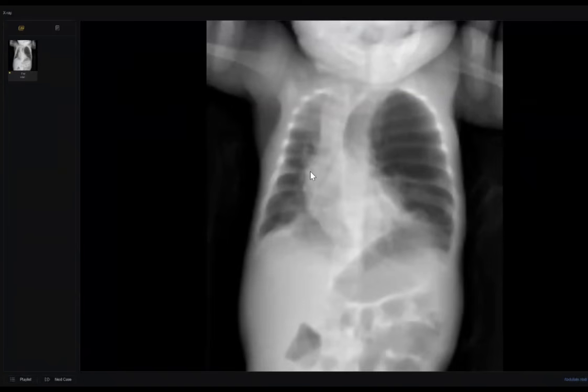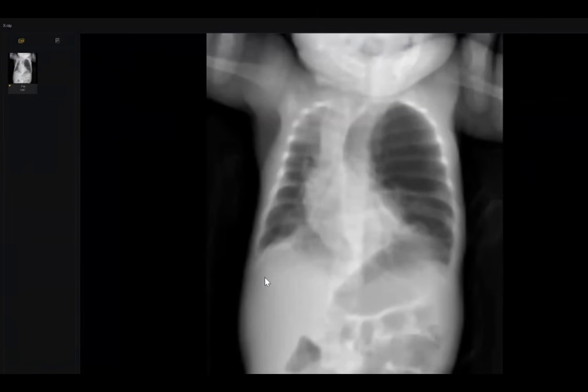Sir, I'm provided with a chest X-ray frontal projection of pediatric age group. I can appreciate that there is hypertransradiancy noted along the left lung field, and there is some contralateral shift of the mediastinum. The left chest cavity appears hyperradiant as well. So, sir, I have a few differentials. This is a very small child, so I'm suspecting this might be a congenital lobar emphysema with contralateral shift.